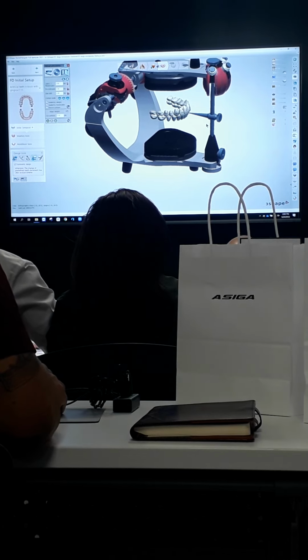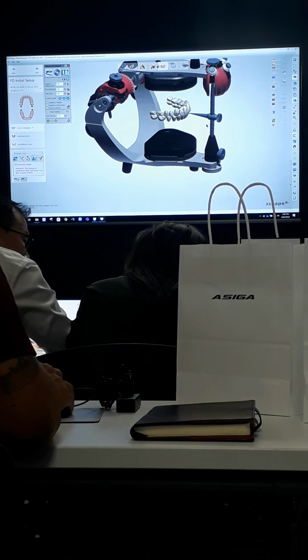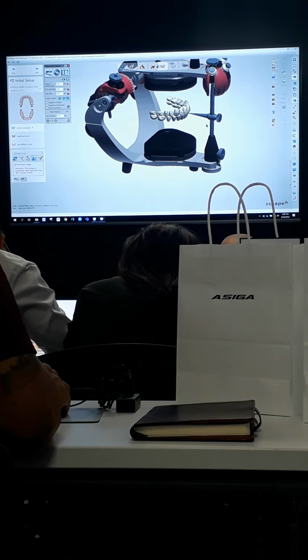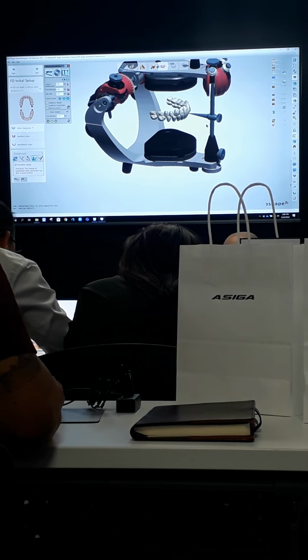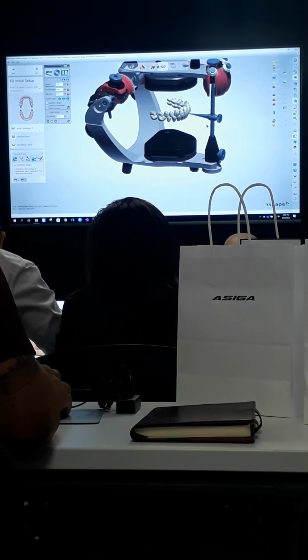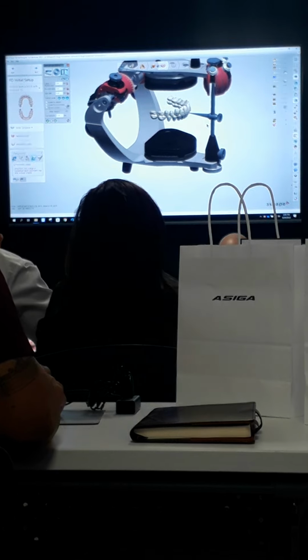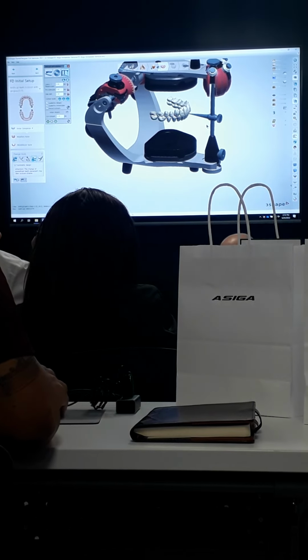Yep. Now, if you had to remount the case and maybe the vertical was off, then you would want to start over, because most of the work that you did wouldn't transfer to the new mount. From my experience, most of the time it's not just a straight up and down vertical issue. It's a lot of other things as well, so it's better to just start over because it's going to be really far off.